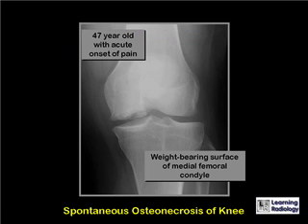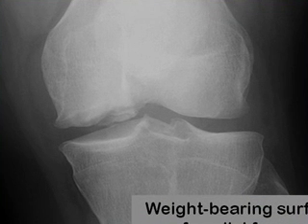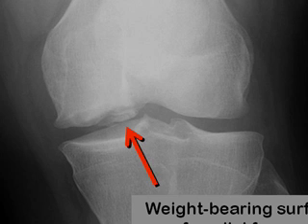This is a frontal view of a knee in a 47-year-old who had the acute onset of pain, and we can see that there is a defect on the weight-bearing surface of the medial femoral condyle.